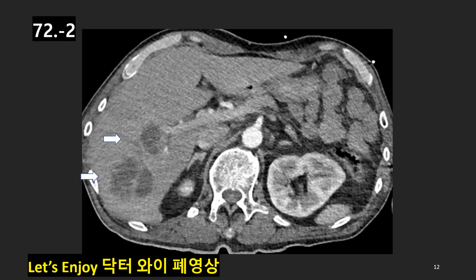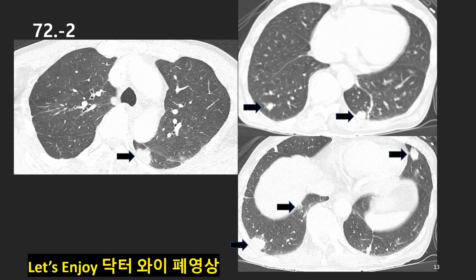How about the second case of the liver CT? In his right liver, we see a few low-density areas of multiple liver abscesses. That's the primary focus of septic pulmonary emboli. In his chest CT, we see several nodules of ill-defined margin, from 1 to 3 centimeters in varying size, peripheral, lower lobe dominance, and bilateral distribution. These nodules are septic pulmonary emboli.